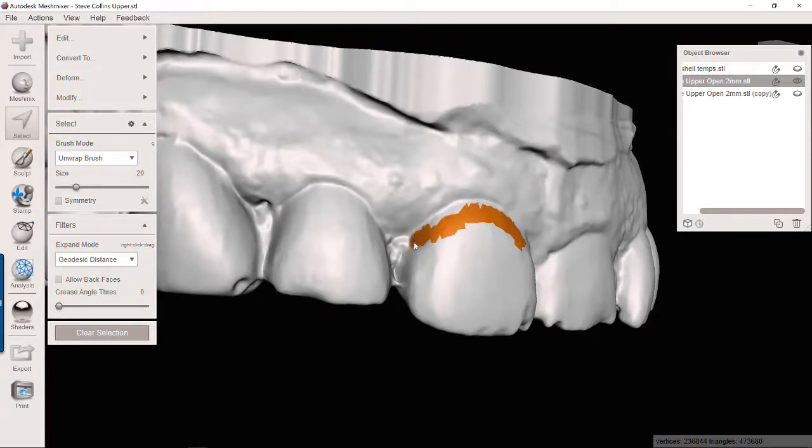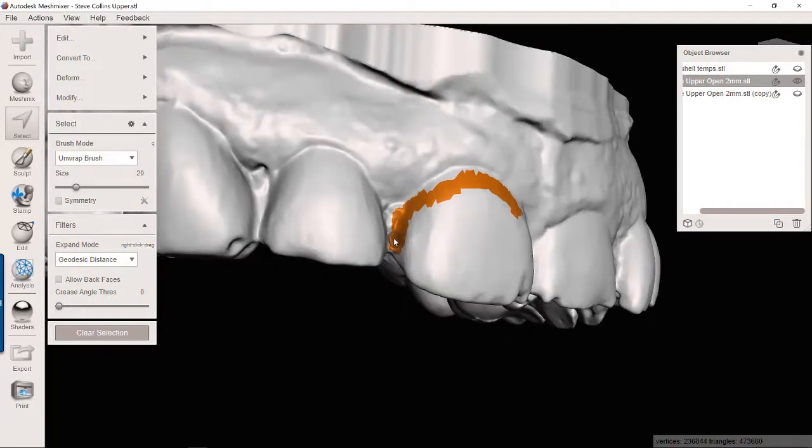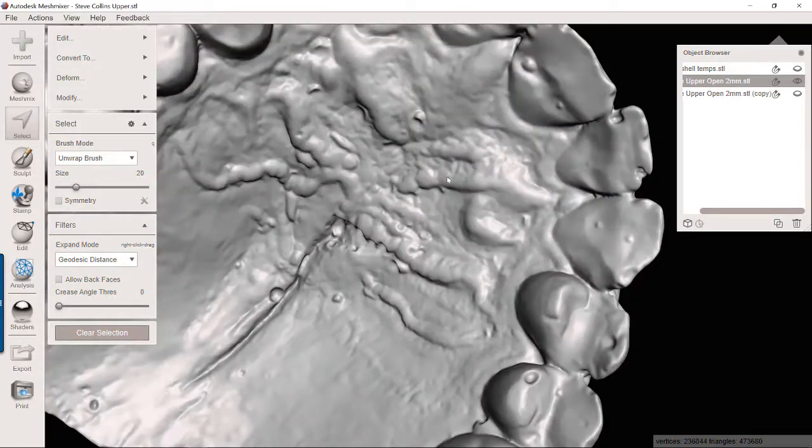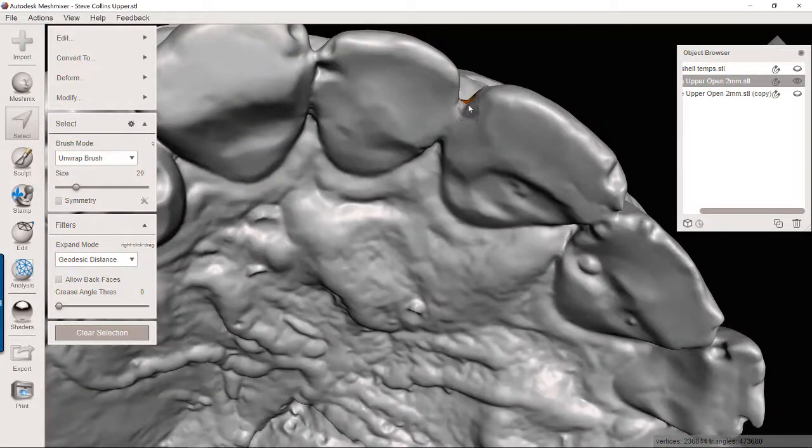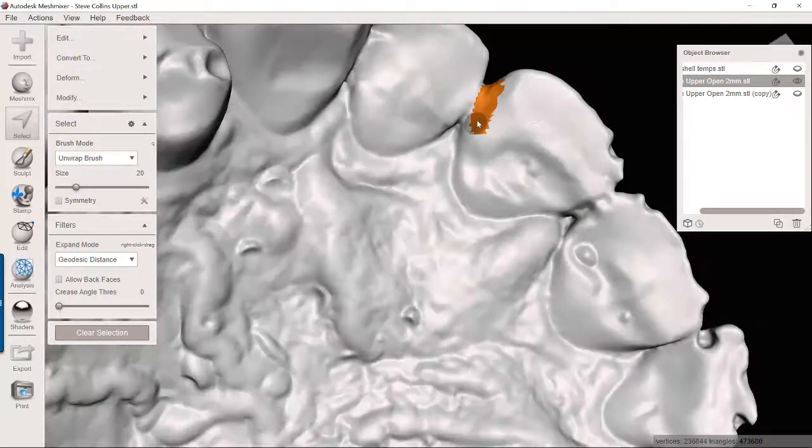Well, that's because when you do a wax up, you generally want that wax up to stop right at the gingival margin. When you create your putty matrix, that enables the putty matrix to create sort of a gasket effect right against the tooth surface, so that all the excess bisacryl material or acrylic or whatever you're using is going to extrude out of the matrix and leave a nice flush margin right to the tooth surface.